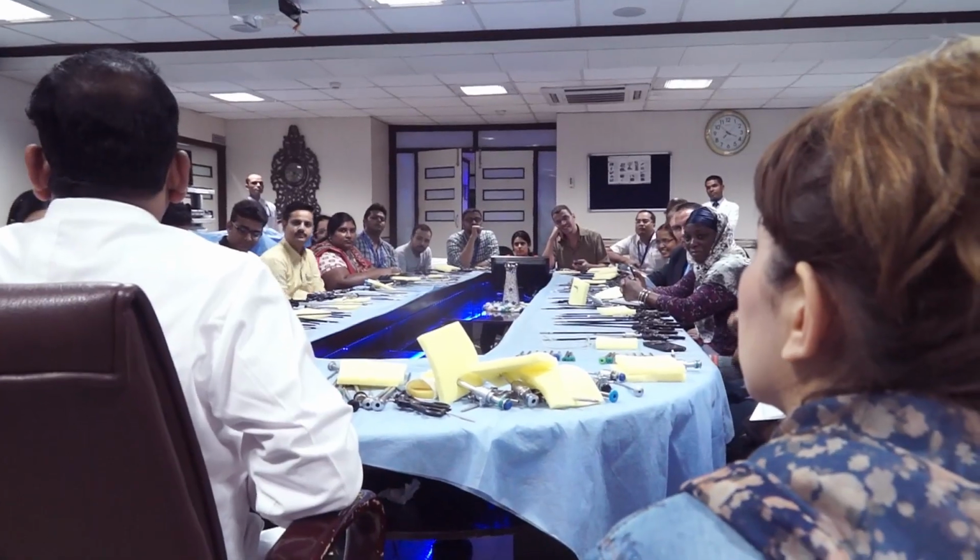There are 5 sets of instruments. The first set is hand instruments, which will be in our hand. These are all hand instruments. Hand instruments are also of two types: one is reusable, another is disposable. We will learn both the reusable as well as the disposable. Today in front of us these are reusable instruments. Tomorrow I am going to discuss the disposable instruments also. So the first set of instruments is hand instruments.